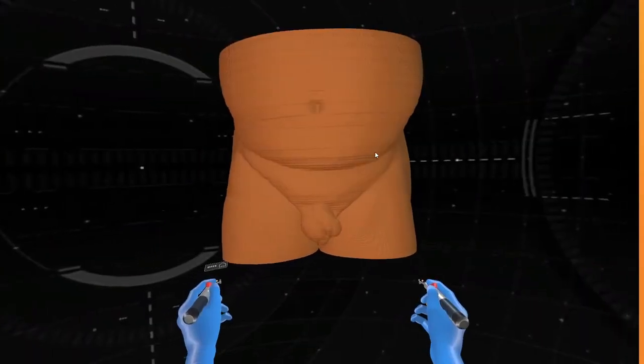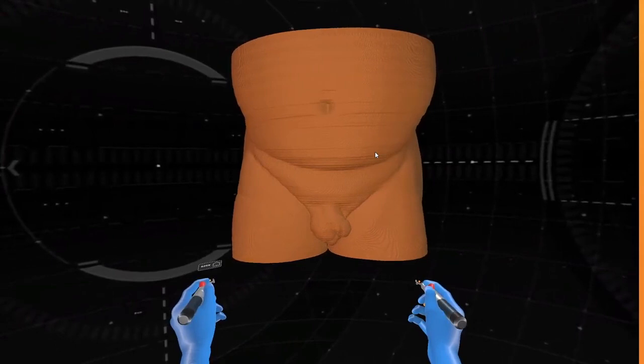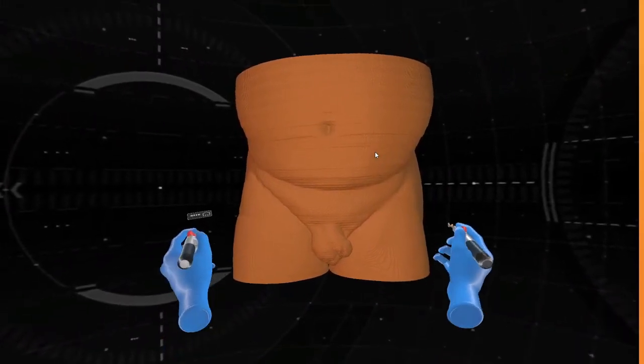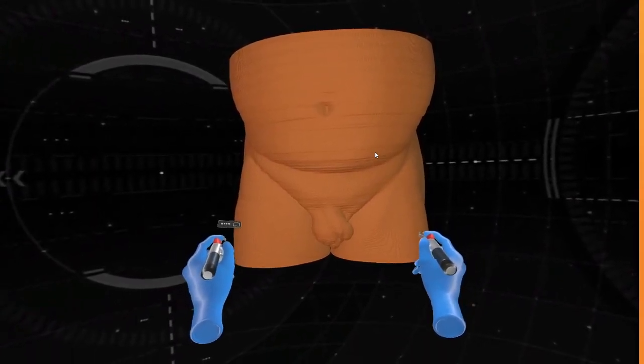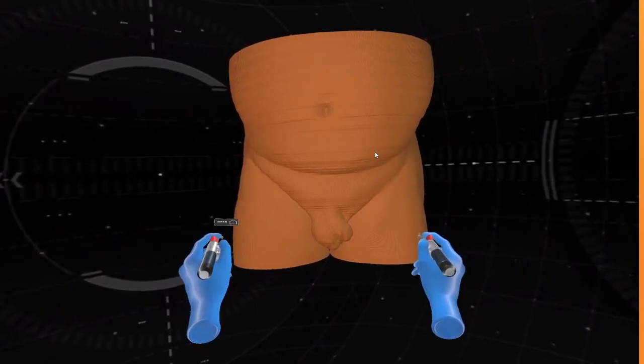The following 3D model was created from preoperative cross-sectional imaging obtained from a patient in our practice. The patient is a 70-year-old male with a history of Crohn's disease and recurrent anal fistula who was found to have an extramucosal anal canal adenocarcinoma thought to have arisen from his anal fistula. The lesion was clinical T3N1 at the time of discovery.